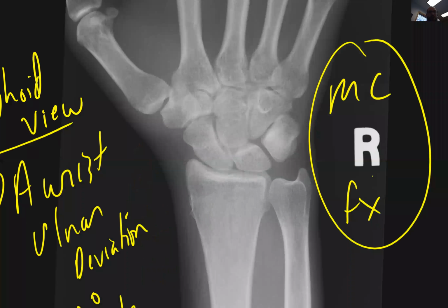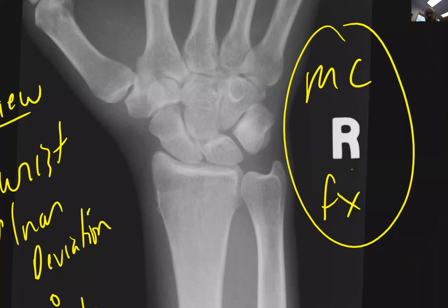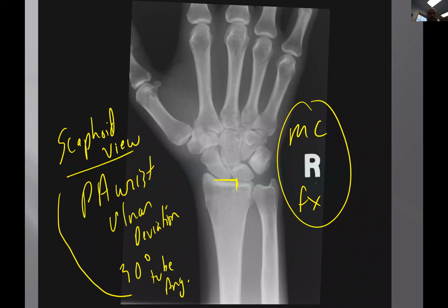Okay, hallucinate with me if you will. Everyone, grab your coffee. Take a sip. And look with me. Look there. I think there's a lucency heading into the joint, an intra-articular lucency into the radial carpal joint. Take a look. Let me draw it in. Right there. Now I'll erase it. All right, and let me expand that. You see what I'm seeing?